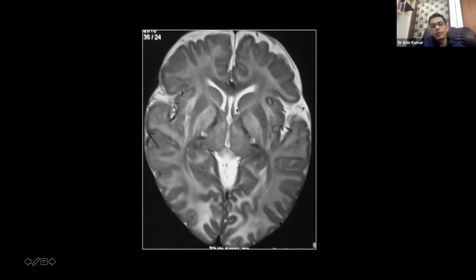We can make a diagnosis of Canavan's in such patients radiologically, especially if we know there is macrocephaly, without any other differential. In fact, Van der Knaap has said in her article that involvement of globus pallidus and thalami with sparing of caudate and putamen is very specific for Canavan's, with only one differential, which is MSUD, as was elaborated by Puneet in his talk.